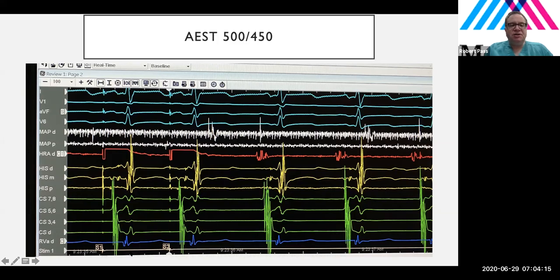And here's the stimulation. And so in this case, we actually started with rapid atrial pacing, which I'm not displaying here, but the bottom line is we do that. I do that normally because I want to see what the AV node can do before we get started messing around with catheters in the heart. It's a good baseline approach. And in this particular case, this young boy could conduct 1-to-1 up to rates of 200 beats per minute or cycle length 300. At that point, he started to Wenckebach.